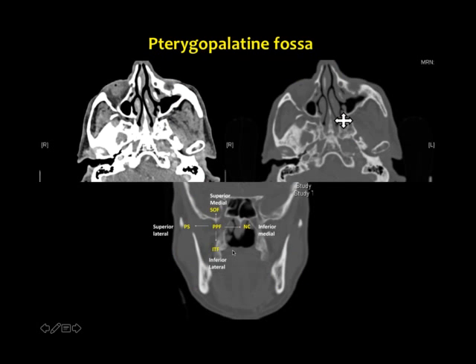As we discussed, this pterygopalatine fossa is very important. This is how it will open. It opens into the parapharyngeal space and the infratemporal fossa on the lateral side, and the nasal cavity on the medial side. Even the superior orbital fissure can get involved superiorly, and inferiorly it can go into the lower infratemporal fossa also. So diseases of the nasopharynx will use this route to come into the masticator space. Diseases of the buccal cavity would use the masticator space and then the infratemporal fossa and go intracranial.